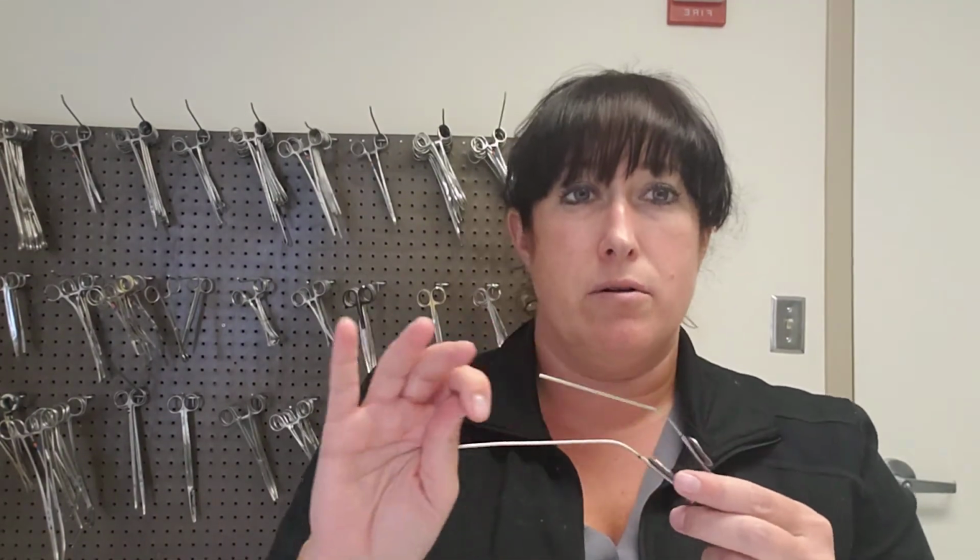Because these are so narrow, regardless of whether you have the 5 or the 3 or 7 or 10 or 12, there are times when they get clogged up during the case, and you can unclog them a couple different ways. One way is to use this stylet. It's just a wire, and they're supposed to come with the Fraser suction tips. What you can do is put this wire through, this one's too big for this particular suction tip, and it would push out any debris that might be there.